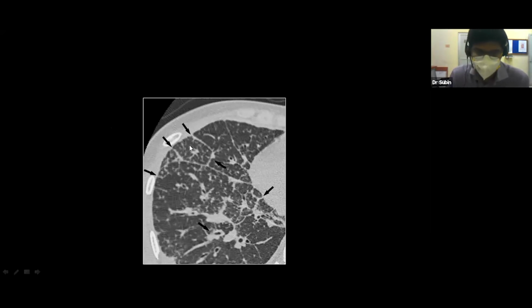Now this one, I'll just tell you. Again you see the interlobular septa, which is what we look at when we see the HRCT. So this is the secondary pulmonary lobule with its interlobular septa. These are the central regions. If you see, there is nodularity along these regions. These are all areas where the lymphatics are present. And this is the fissure. Again, along the fissures there are lymphatics.